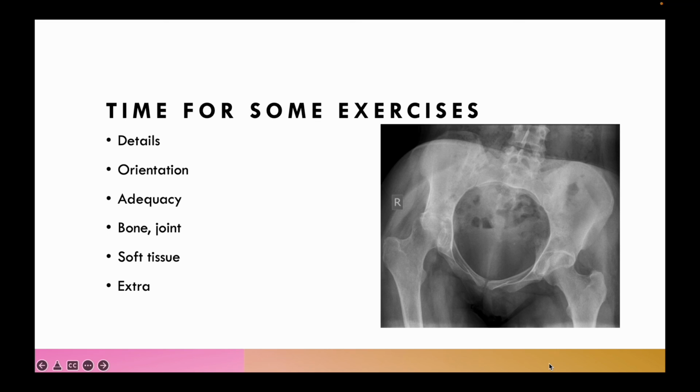Then coming to adequacy, the radiographic film appears to be adequate for assessment of both hip joint and both hemipelvis and the sacroiliac joint. However, it appears to be underexposed.